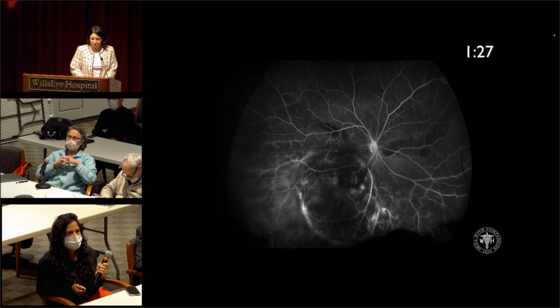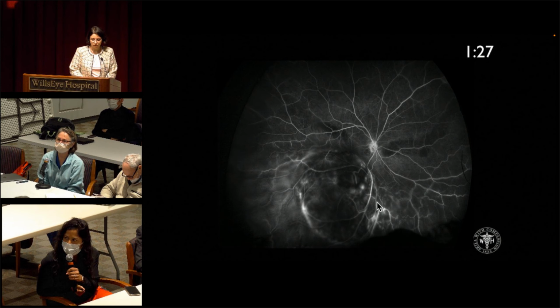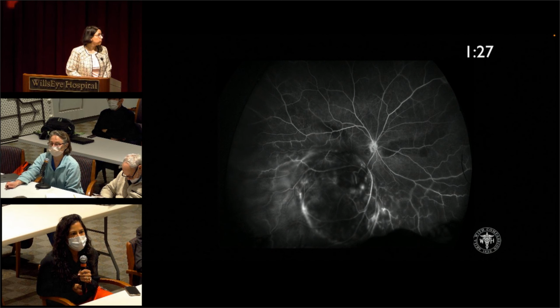Yeah, so here we are at 1 minute and 27 seconds. This, I believe, is that vessel you were talking about, Dr. Shields. So what would we be looking for if we're calling it a draining retinal vein? Yeah, to me, it looks like a draining vein. So it'd be interesting to look at the OCT and see if there's retinal infiltration at that site where this might be draining this deep mass. It doesn't impact the patient's outcome that we know of.